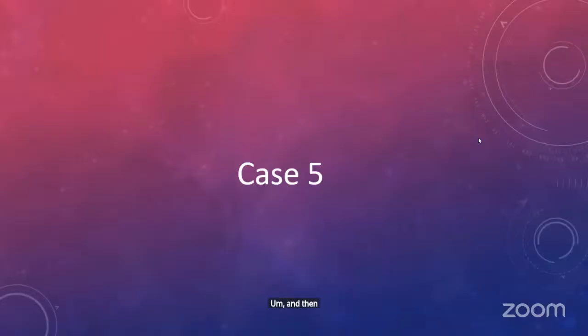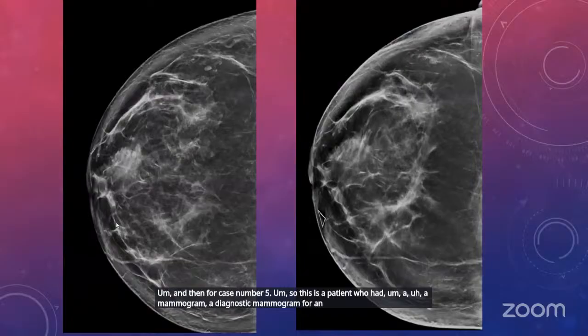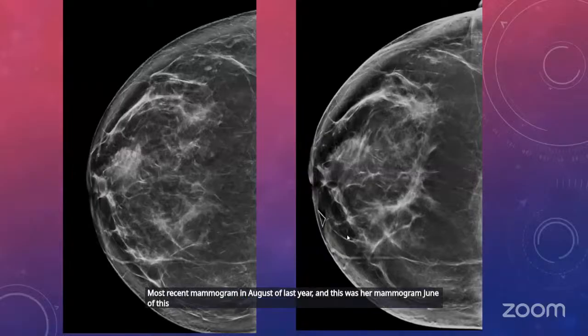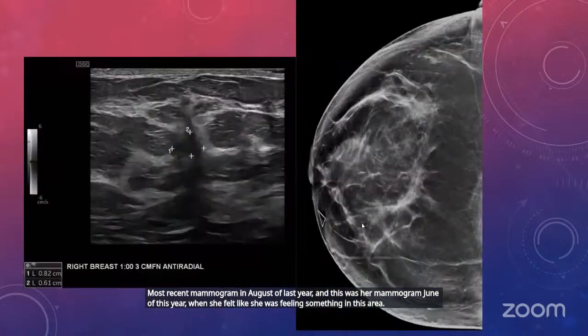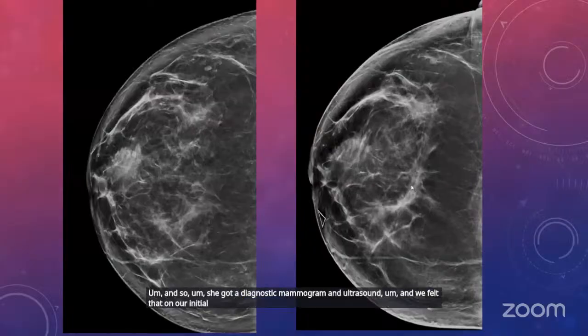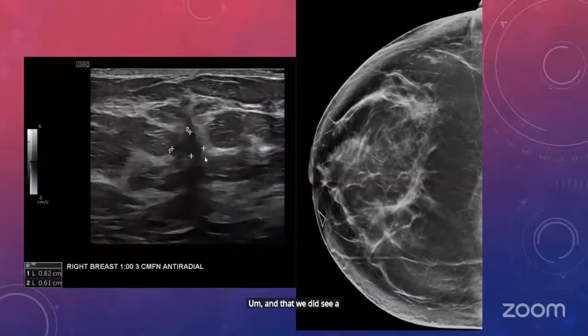And then for case number 5, this is a patient who had a diagnostic mammogram for an area of palpable concern. This was her most recent mammogram in August of last year, and this was her mammogram in June of this year when she felt something in this area. She got a diagnostic mammogram and ultrasound, and on our initial assessment we were concerned about this asymmetry underneath the area of palpable concern, and we did see a mass in this area measuring about 8 millimeters.